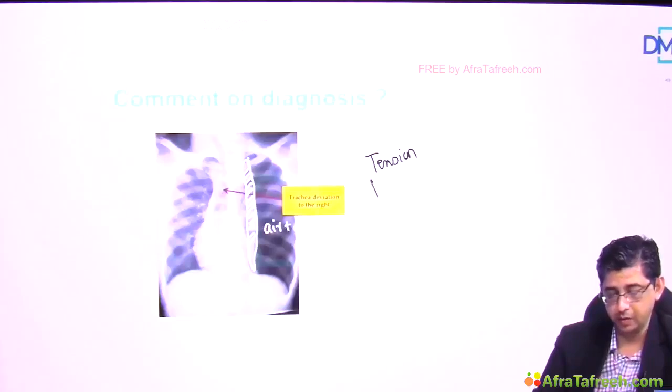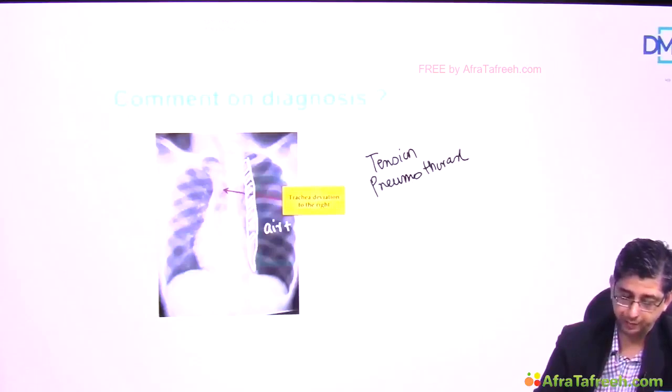I kept multiple images of tension pneumothorax because that is the one that is most difficult for most students to appreciate. Also look at this particular area.